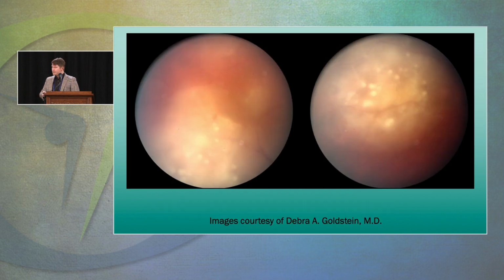One more photo here showing the ground glass indolent retinitis that's in syphilis with these white spots. I have not personally seen these spots, but reportedly they are classic. So if you're looking at something that looks like ARN and they have these small white spots in it, they apparently tell you that it's syphilis off the bat, according to my mentor, and I've been looking for them since I trained with her. I have not seen them yet.